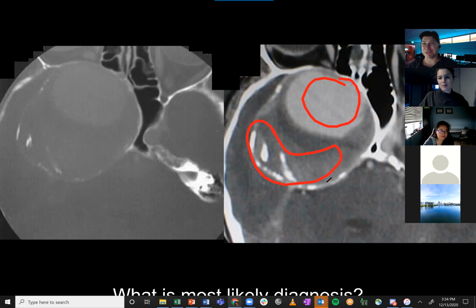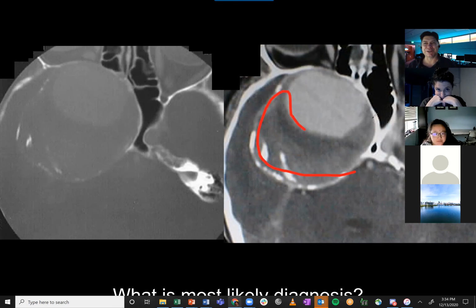So when I first got this study, I said, well, it looks kind of like an aneurysm, but I've never seen an aneurysm this big. That can't possibly be an aneurysm. But it turned out that it was. This guy had just had an aneurysm for decades, and this thing was just getting bigger and bigger without popping, apparently. So that was actually all thrombus in that area.